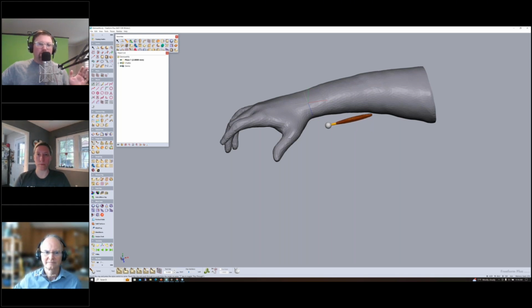Some people are going to be watching this and say, oh my goodness, look at all the steps. Well, when we get to the next part where some of the automation can take place, I hope you'll be able to see the building blocks. I think the biggest thing for me is with Freeform, I never am going to get stuck for an output. I can always make something work. And also Freeform has a great mesh editing tool.